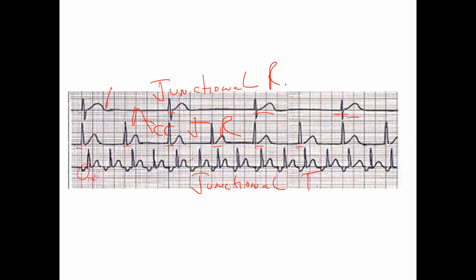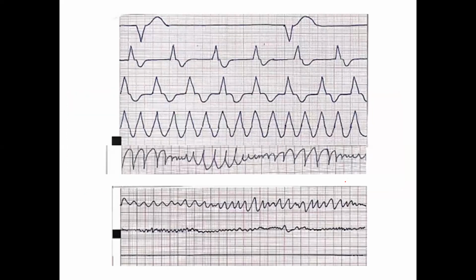Tachy, right? Everybody okay? Junctional tachycardia, right? Did I miss something? Oh, that's right. Okay. Thank you.